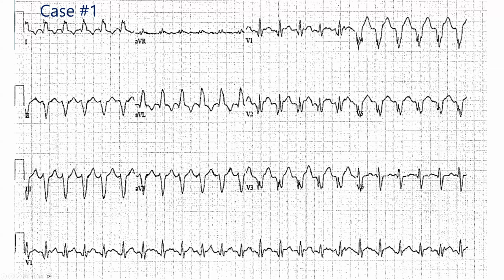And like we talked about earlier, this is clearly a wide complex tachycardia. It's negative in the inferior limb leads, so the axis is going from the bottom to the top, possibly consistent with ventricular tachycardia. But you see that there's a fairly well-formed QRS complex, at least in the anterior precordial leads, which is the kind of thing you may expect if this is either supraventricular tachycardia with aberrant conduction through the ventricles, or possibly, if it is truly a ventricular tachycardia, a focus that's coming from relatively close to the conduction system.